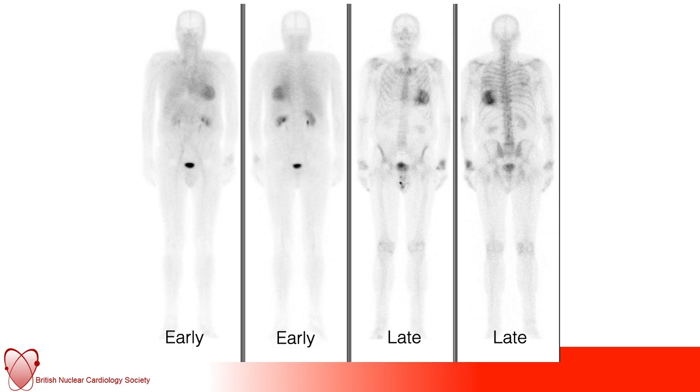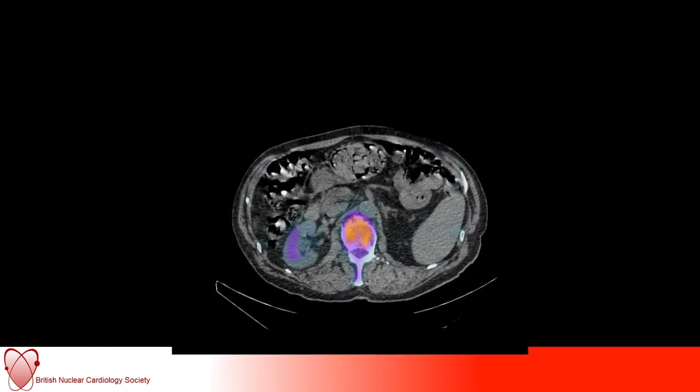It's stronger than the adjacent ribs, so by definition we're looking at either a grade 2 or 3. But if you look posteriorly, you can probably reasonably easily count the ribs and the vertebra, and so I would say this is more a 2 than a 3, whereas in a 3 you tend to find it very difficult to count the ribs and the vertebra. You can see that it's difficult to see the humerus on each side and the femur on each side, and therefore there is some long bone suppression as well.